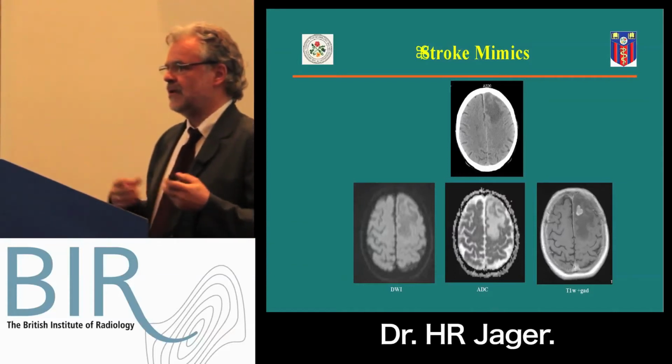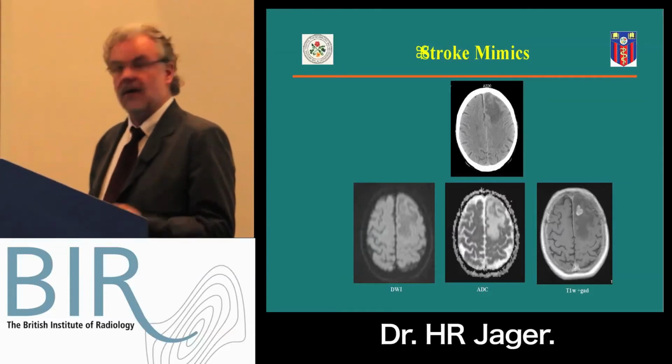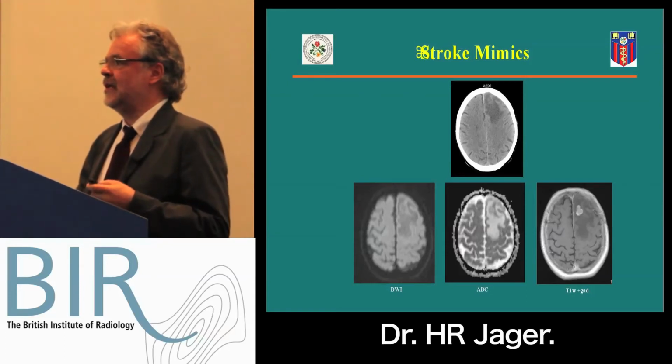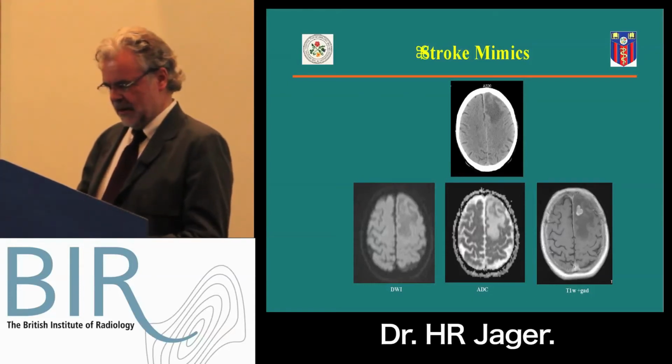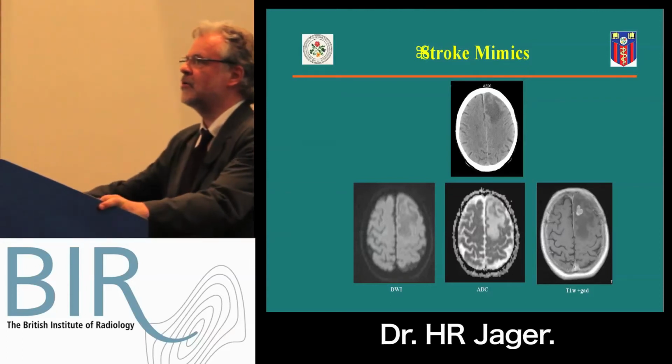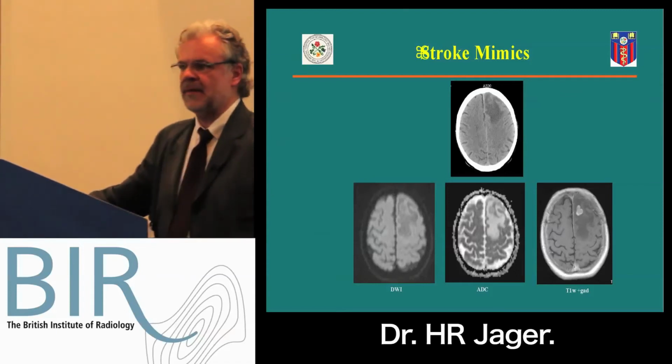presentation. So the diffusion shows you immediately. On the CT, cytotoxic and vasogenic edema, white-matter edema look dark, but on MR it's the opposite. Good. We already talked about brainstem strokes and the demarcation on the midline.